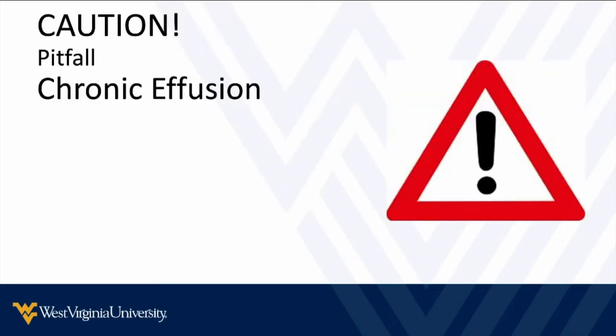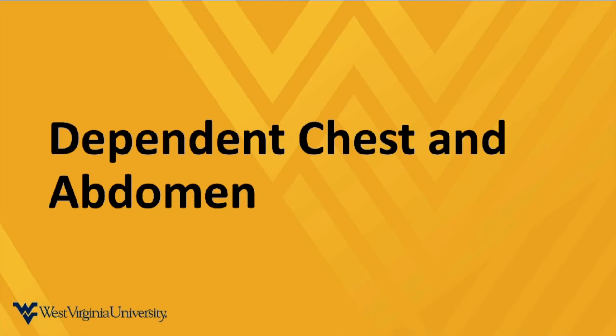Now, I kind of alluded to this already. Just remember, people can have chronic effusions. There are people walking around with fluid in their chest, fluid around their heart, fluid in their abdomen that's been there for other reasons for a long time. And as always, we need to be clinicians and make clinical decisions based on not just the ultrasound, but all of the information in front of us. Okay, so we talked about the anterior chest looking for pneumothorax. We talked about the heart.